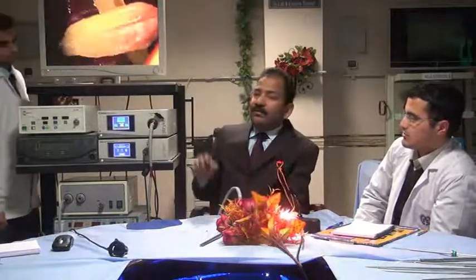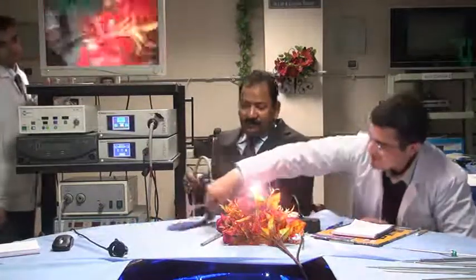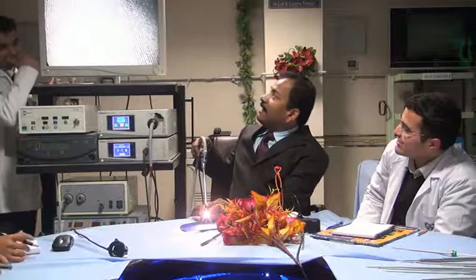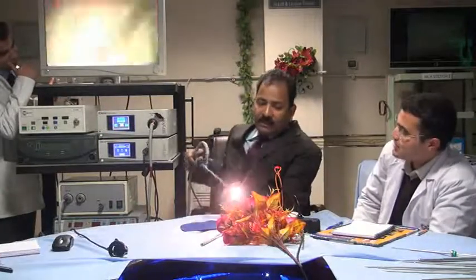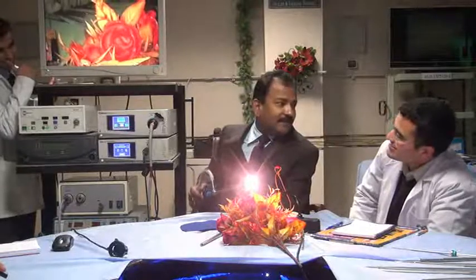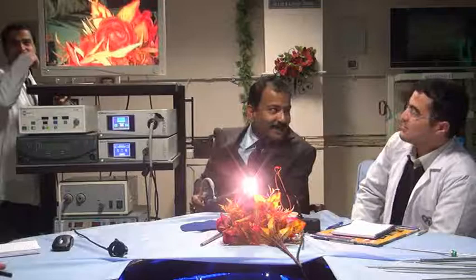With these three primary colors, we can make millions of colors. Again I will do white balancing, and we are doing white balancing. And this color has been removed. See now other colors are wrong. Are you seeing this one is better?